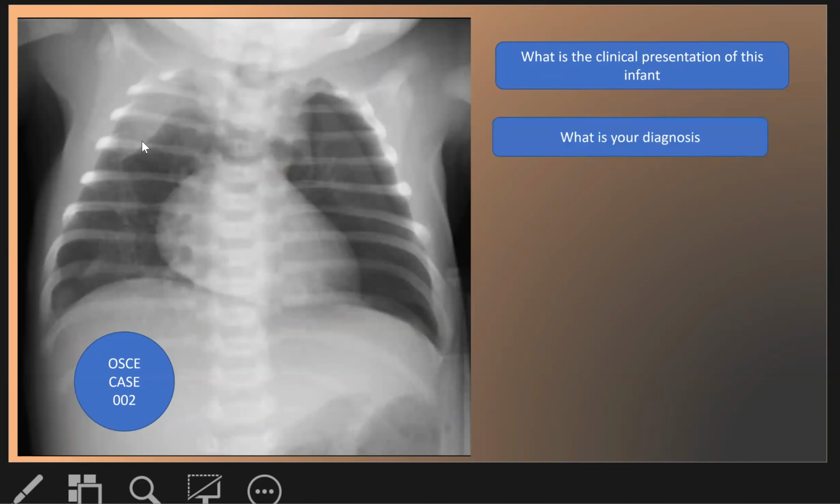And we have a pneumomediastinum, and the thymus here is elevated upward. Probably this is an artifact, and this is a skin fold rather than a pneumothorax. So this patient has left-sided pneumothorax and pneumomediastinum.